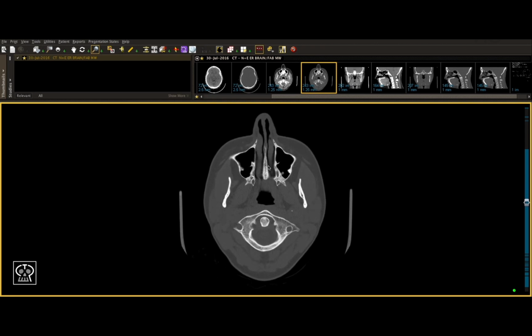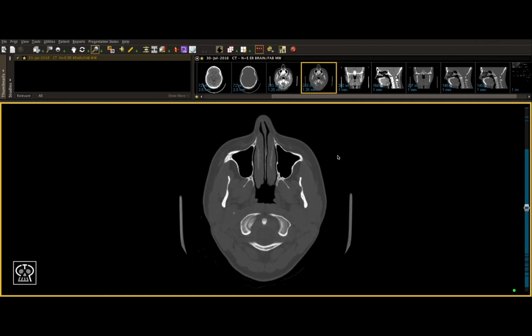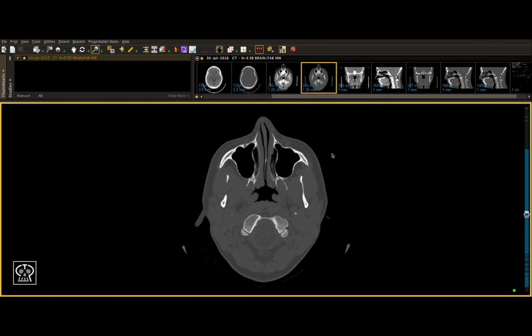As we continue to scroll up, you'll see these two large radiolucent cavities on either side. These represent the maxillary sinuses. One of the most common fractures you'll see on a CT scan are fractures of the walls of the maxillary sinuses. This is because they are extremely thin and are often fractured during any kind of trauma. Another clue is when examining the sinuses, if you see a radiopaque fluid material within, this likely could represent blood, indicating trauma or fracture to a surrounding bone or area.